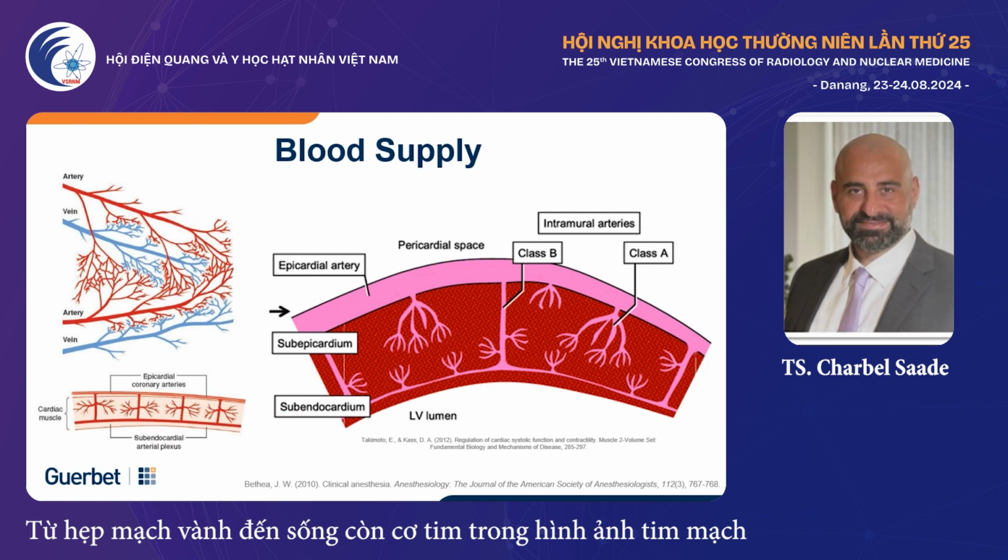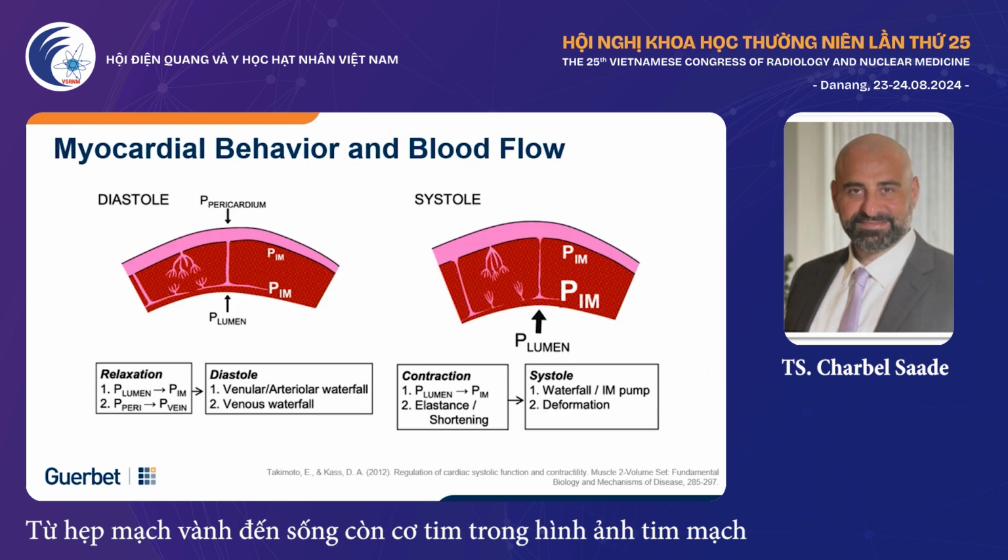Now these class A and class B vessels change during contraction. At end diastolic phase, when you're having maximum relaxation, your class B vessels actually get really good flow of contrast into the subendocardium. On the systole, it actually disappears and is also less. So imagine contrast going in, contracts, contrast coming back out, contrast going back in, and slowly perfusing the coronary circulation.